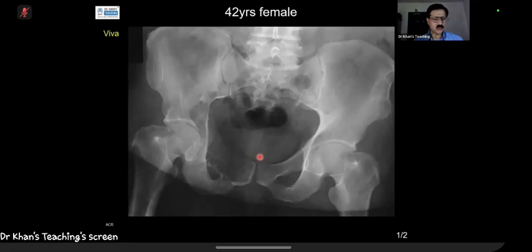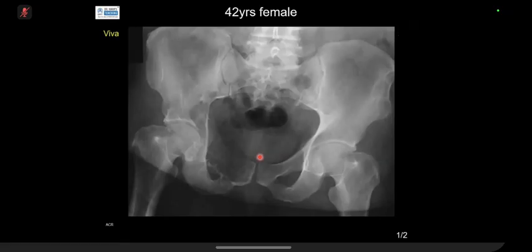Yes, candidate 2. I have been presented with a frontal pelvic radiograph for an adult patient. The main abnormality, I can see that there is expansion of the right superior pubic rami, associated with a lytic lesion. I cannot see the outer cortex of this bone completely, so there could be some sort of erosion. In comparison with the left side, the left superior pubic rami appear normal, and there is no lytic lesion. Regarding the rest of the bones, I cannot see any similar bony lesion.